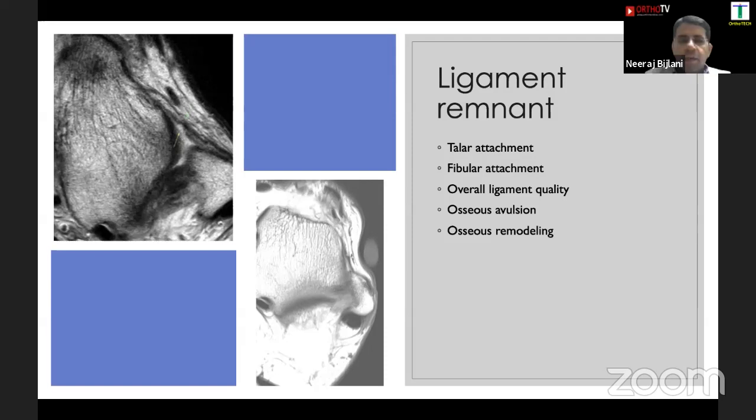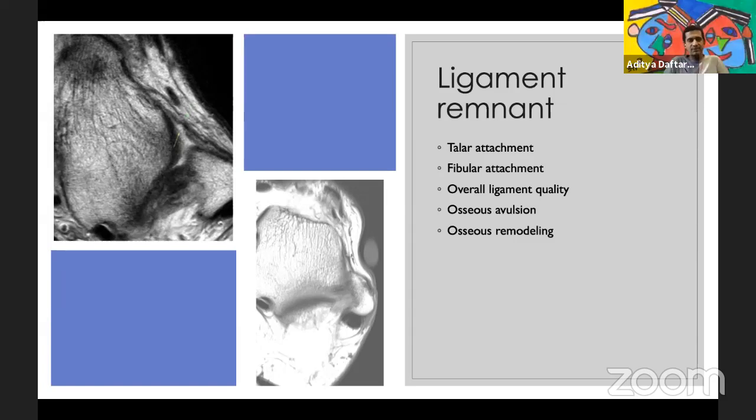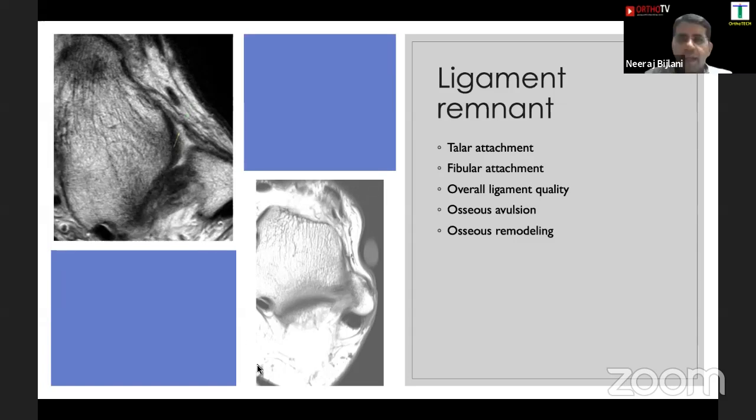Yeah, but that is a very good thing from the ankle sprain point of view, where the patient is not becoming all right for a long time. Right, and we really don't know. So I would like to share my screen and show you one MRI. Just let me know your opinion on this.